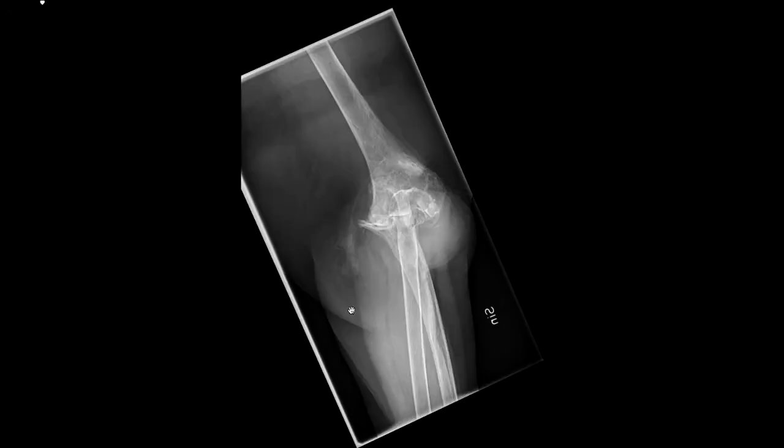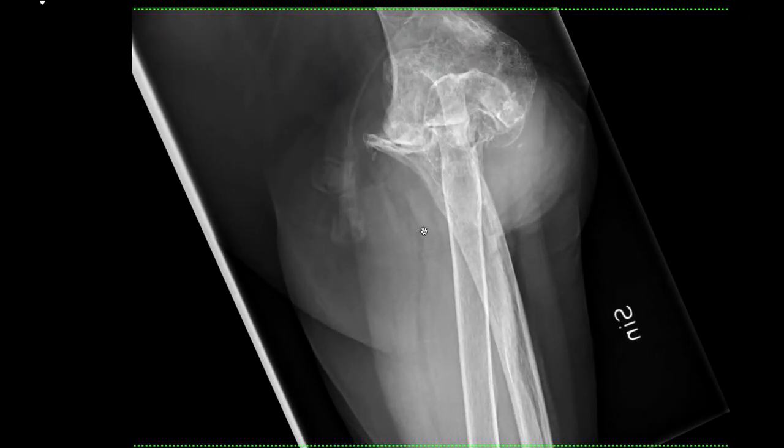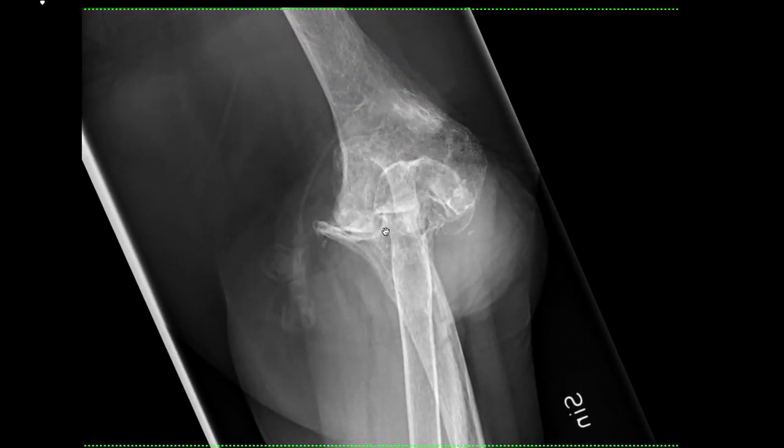Another image just to see how it looks. It's a really big mess here, so when you see all this, all you want to do is cry because I can't see anything here, but it doesn't matter. You saw the fracture on one image, you can move on.